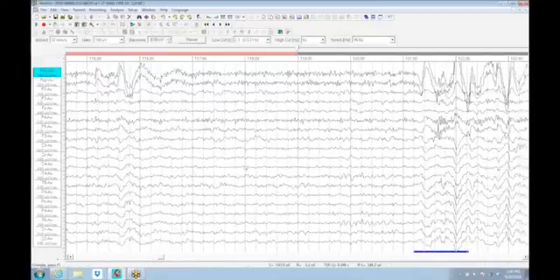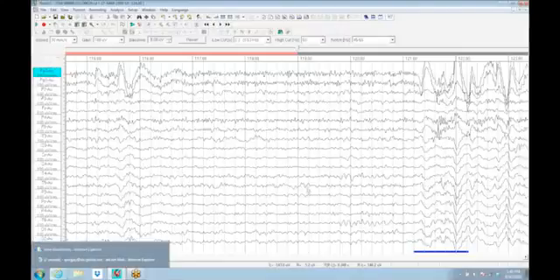It's got EEG frequency filtering capabilities. It's got all sorts of fairly high levels of analysis. You can do manual extraction of chunks and analyze it separately from doing the ICA extraction and compare your results. You can compare results between multiple montages and actually see where things come from fairly well.